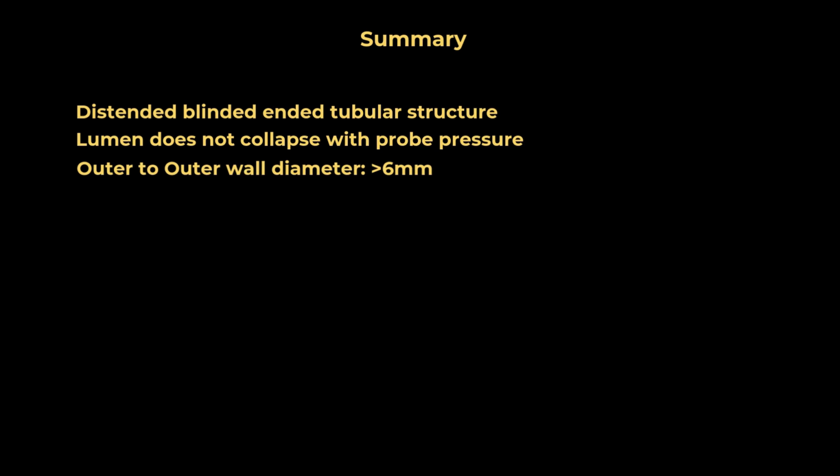However, size alone is not always reliable. The normal appendix may be distended with air or fluid. In children, the appendix can be enlarged due to lymphoid hyperplasia. If the diameter is less than 6 mm, appendicitis is very unlikely. However, infection can still be present if secondary signs are seen, such as increased wall vascularity.